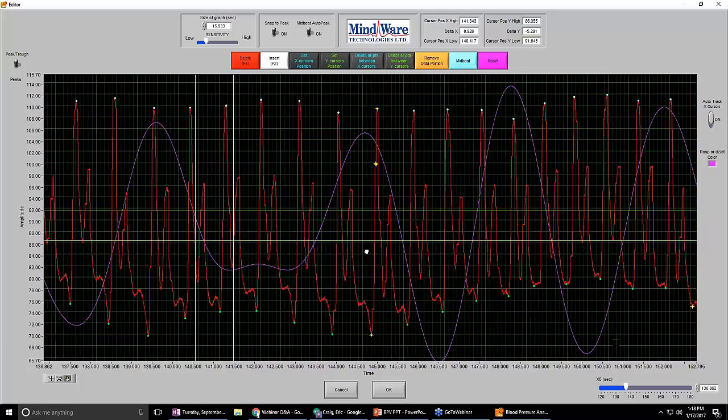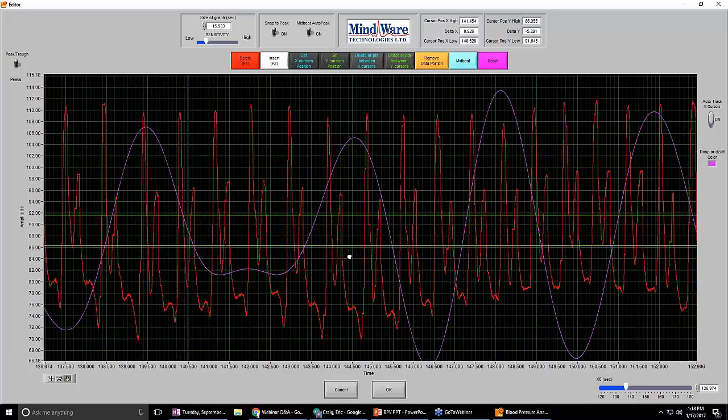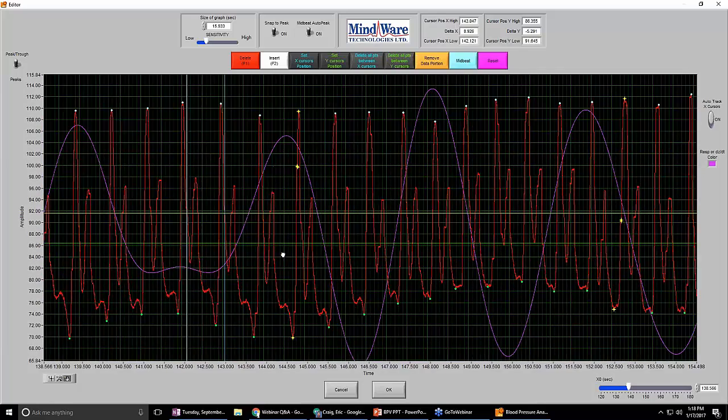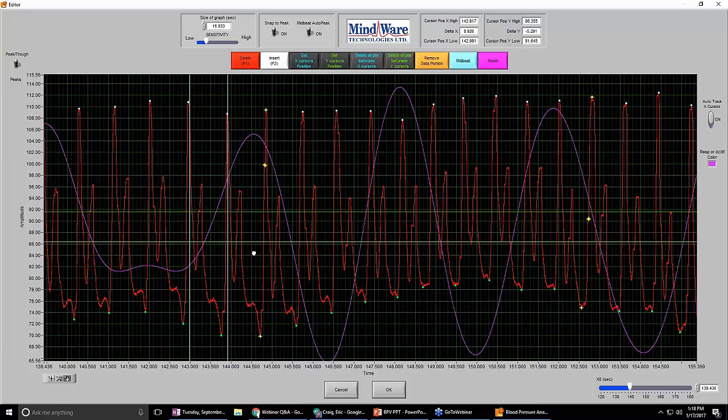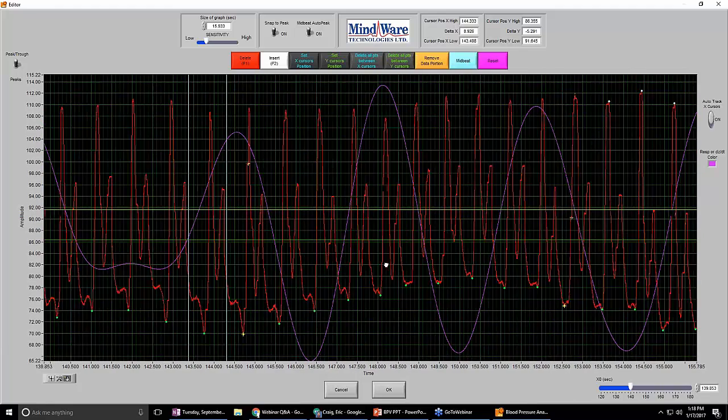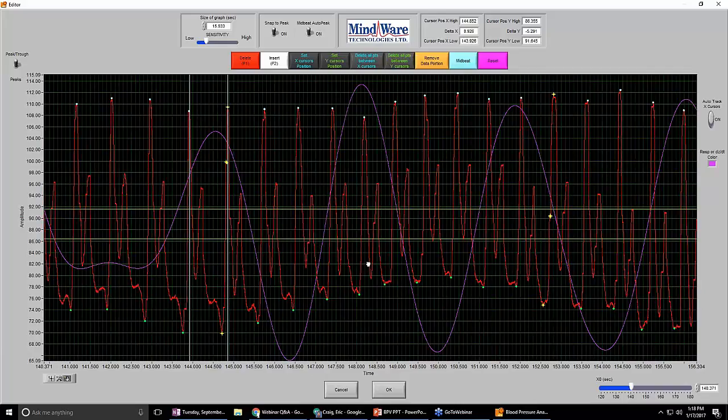We begin with a good complex, and then we go forward. So I think I started here, so we line them up, and then we move these over the next ones. We can see these are still pretty similar, not a lot of variability yet. Then we can move this over and start to see which is the good one. That should be pretty easy and apparent, depending on how noisy your data is, but that's a good way to do this.